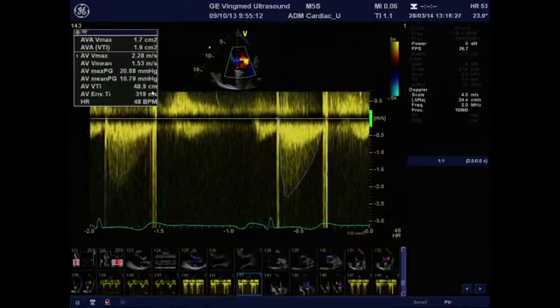And using all those parameters, you calculate the aortic valve area of 1.9. And when you do this, it's really important to compare that value with the reference value that you can find in reference articles. And for a Carbomedics number 25, the reference value is 2 centimeters squared. So you are in the normal range for that kind of prosthesis.